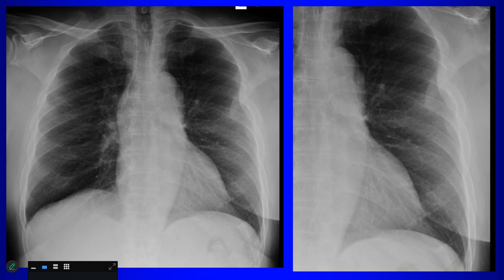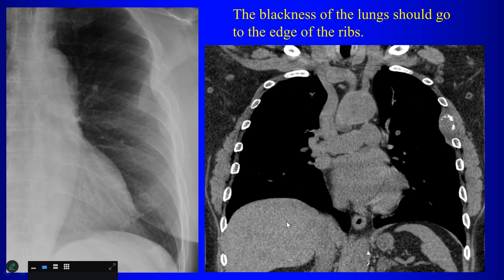How about we look at other things besides the hilum? Is it the AP window? It's maybe a little bulging convexity. Nothing? Rib fracture? No rib fracture. Really? Oh, come on. That rib's destroyed. There's a tumor here.